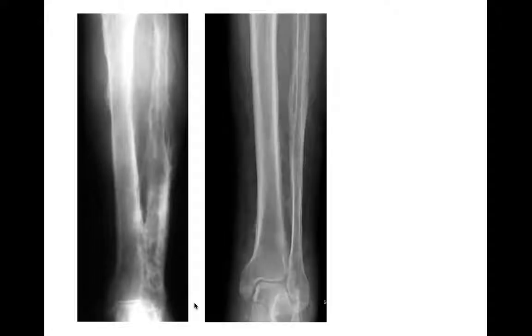There's another case, a radiograph of the lower extremity. This looks really bizarre. I'm not sure this periosteal reaction fits into any of the neatly classifiable ones. Clearly there's some periosteal reaction here. It's wispy and quite prolific along both the tibia and the fibula. And there's some solid thickening here, and there's this wispy periosteal bone around it. Very bizarre looking. This is just a strange case of periosteal reaction from venous stasis. Not the most common appearance of periosteal reaction in venous stasis, but long-standing venous stasis is a common cause of periosteal reaction. You see that in the lower extremities a lot.